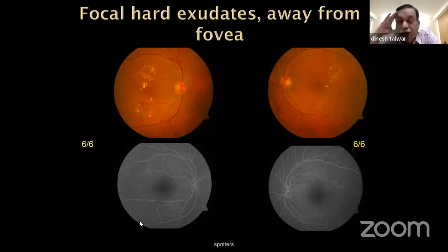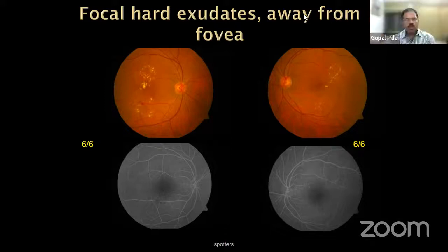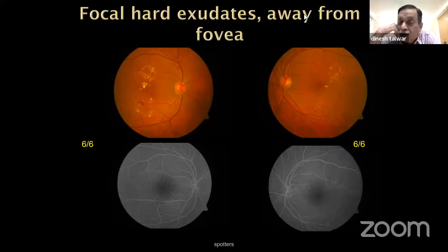So since we are doing image based on fundus photography, so will any of them interact? What are the features of beginning? Dr. Gopal said severe or moderate to severe NPDR. What are the features of that in these photographs? Are there any photographs, pictures of that?